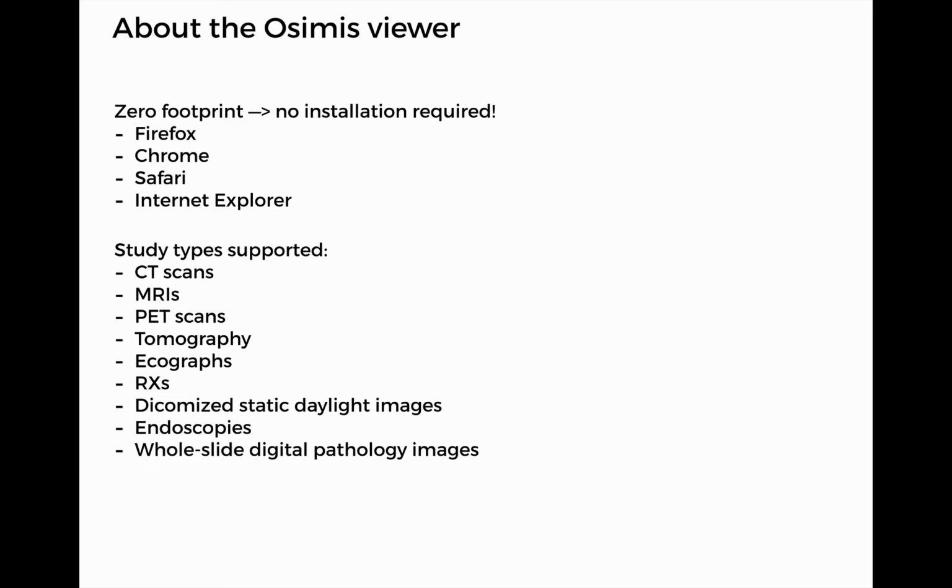It supports a whole series of image types, including CT scans, MRIs, PET scans, tomography, echographies, X-rays, as well as DICOM static daylight images, endoscopies, and whole slide digital pathology images. It is optimized for use on mobile devices, so you can use it either on a desktop device with a mouse or with a multi-touch mobile device.